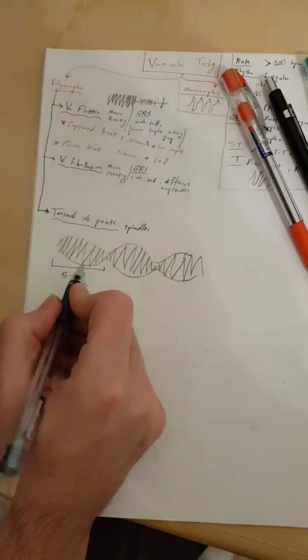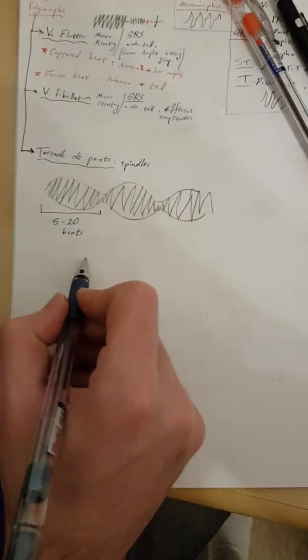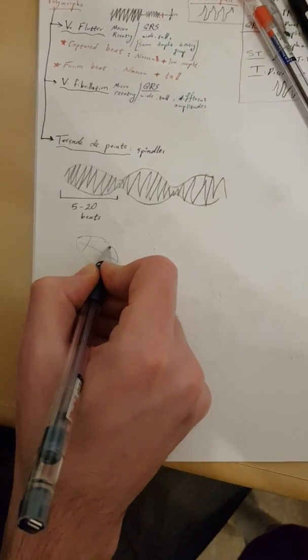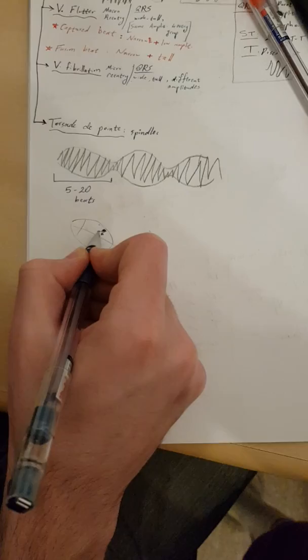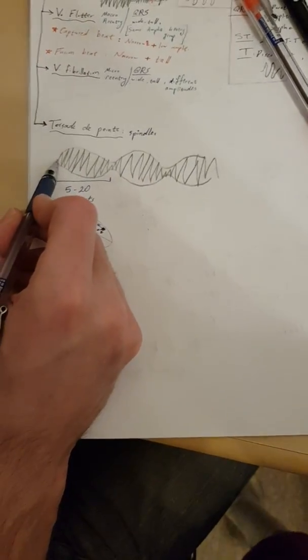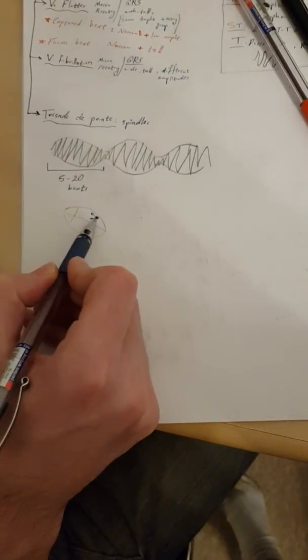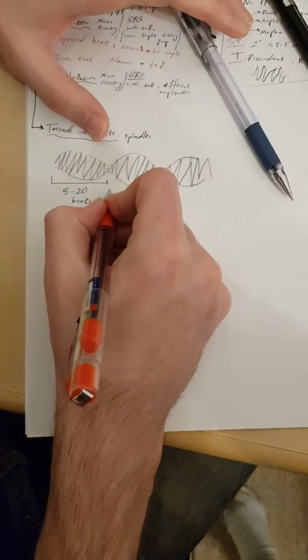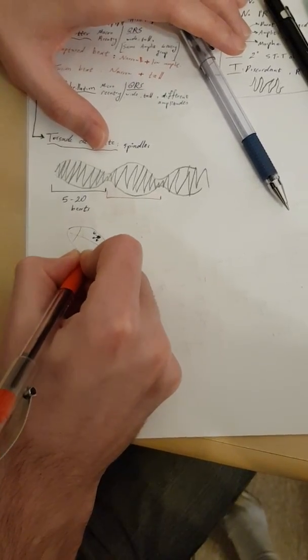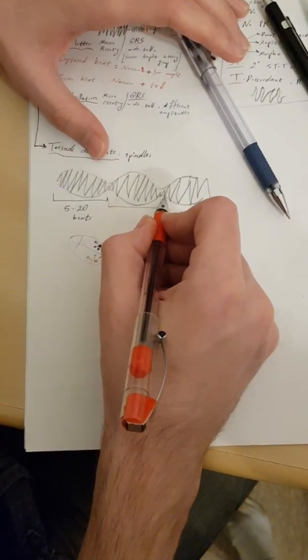Now what happens in these? Every spindle represents a focus in the heart, in the ventricles. So let's say this one started beating, giving you impulses throughout these. Of course, in the beginning, it begins strong, and then it kind of dies out. It gets exhausted. Then another one takes over and starts giving you the impulses, and then it dies out, gets exhausted, and then another one.